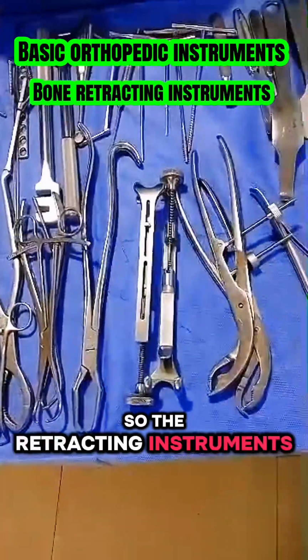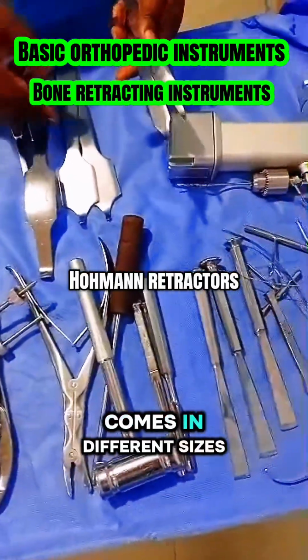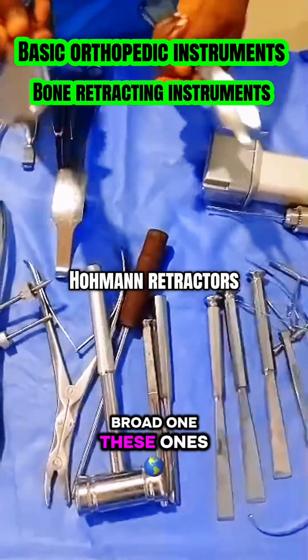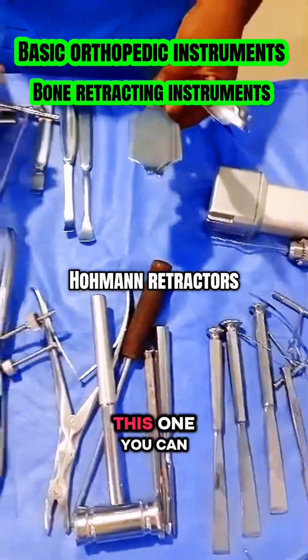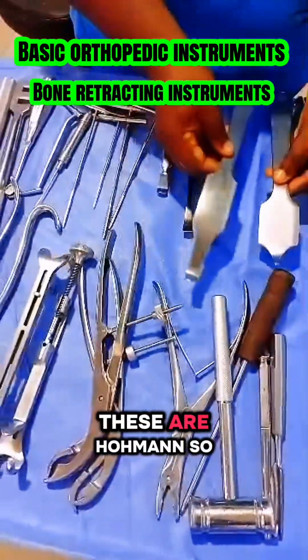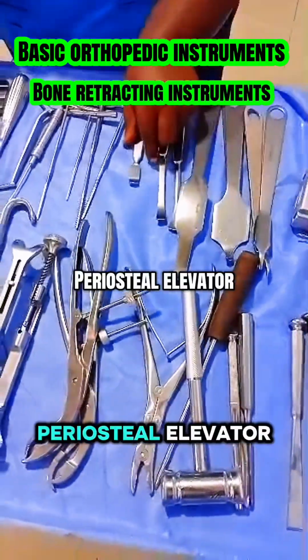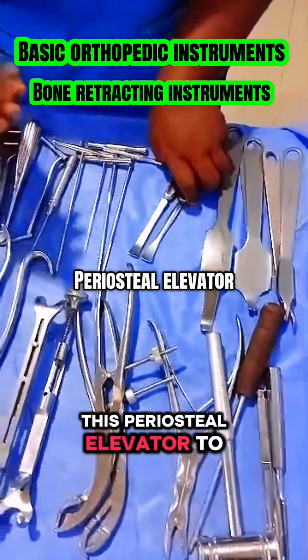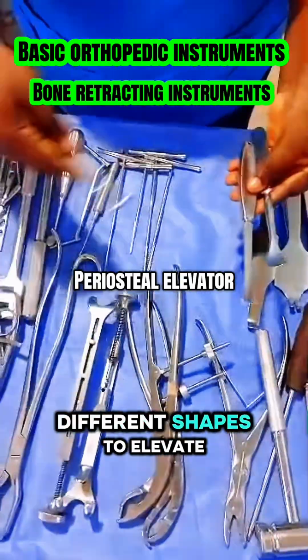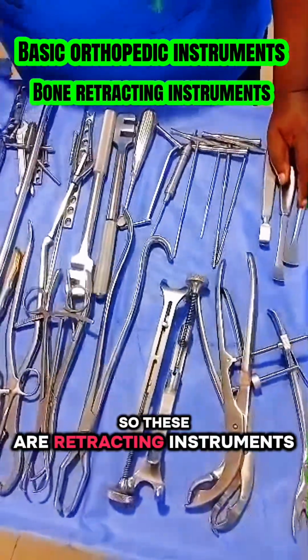So the retracting instruments, you have the Hohmann. This Hohmann comes in different sizes. This is the slender one. This is the broad one. These ones are sharp. These ones are blunt. This one you can use when you are doing something on the femur. These are Hohmann, so you use them for retraction. You can also use a Periosteal Elevator. You can see them in different shapes to elevate the periosteum from the bone. So these are retracting instruments.